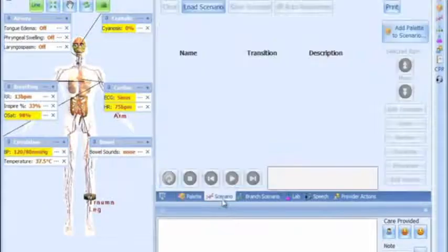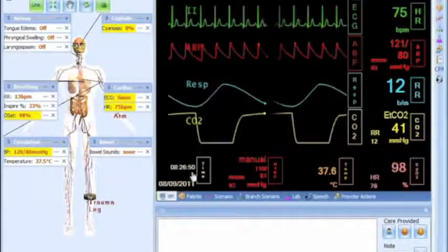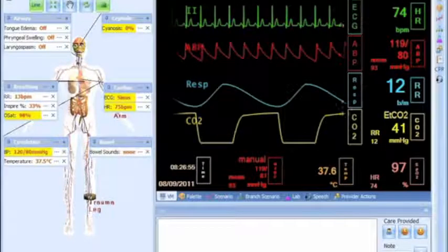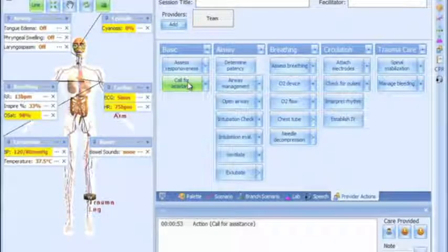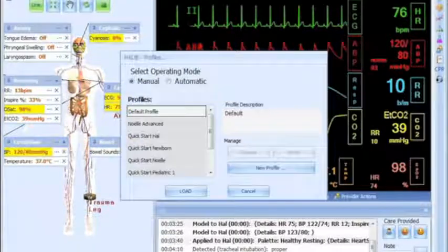To the right, the user will find the rest of the controls in an easy-to-follow array of tabs. A new feature that is shown immediately in the first tab is the virtual monitor. The log box is placed below the array of tabs to reflect feedback of the procedures being performed by the providers. Giga can be used in two different ways.